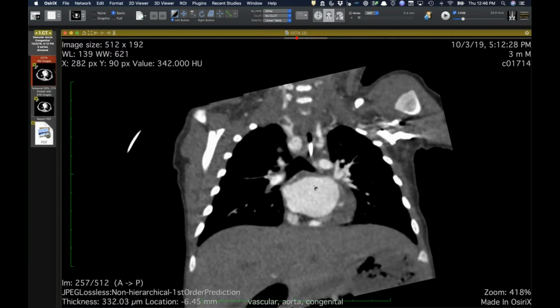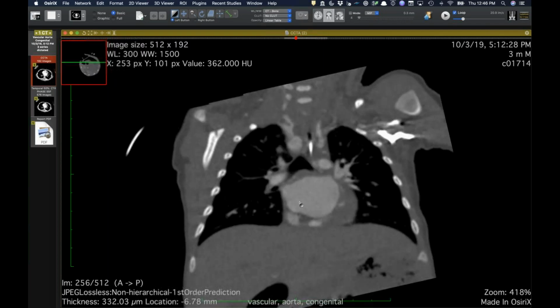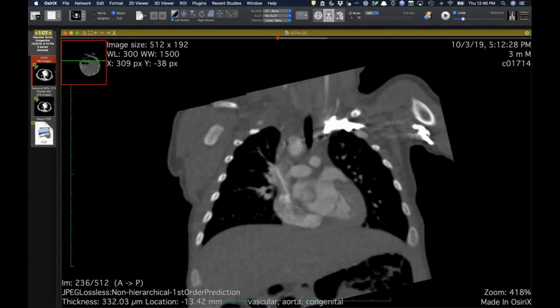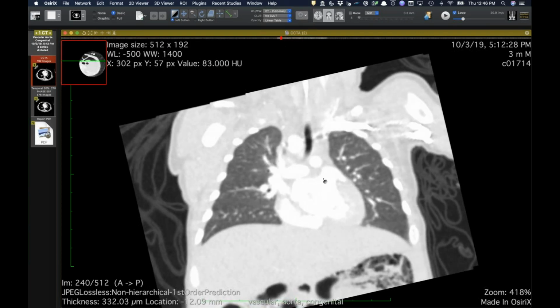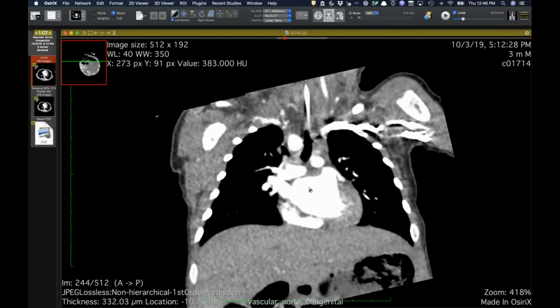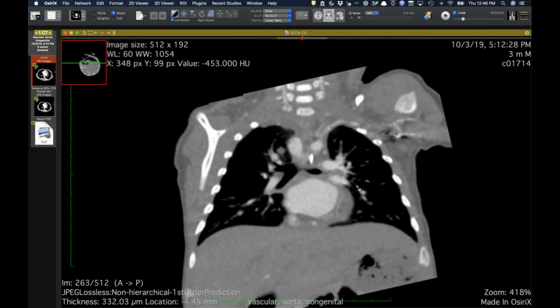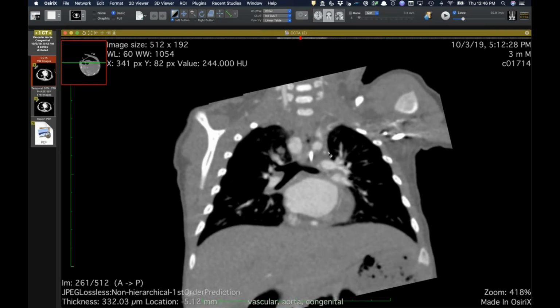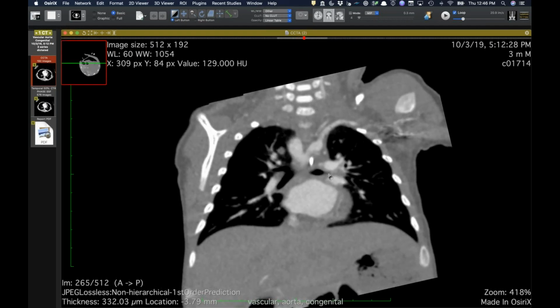I'm still waiting for the surgical confirmation, but this is no surprise. This patient has narrowing of their airway, and they were having trouble with feeding as well. So I think the configuration on the coronal view is very helpful in determining double aortic arch. But I do think there's also a left ligamentum, probably right here, a tiny little divot that's contributing to the vascular ring as well.